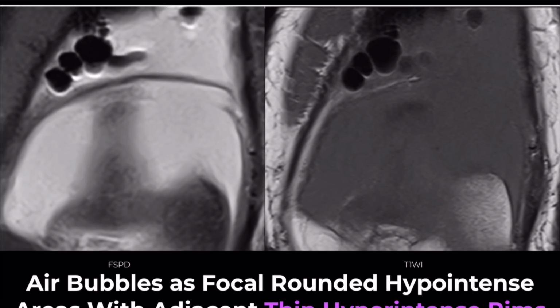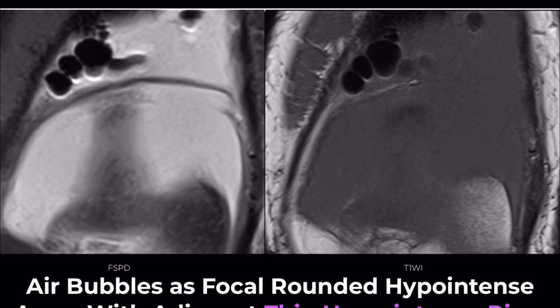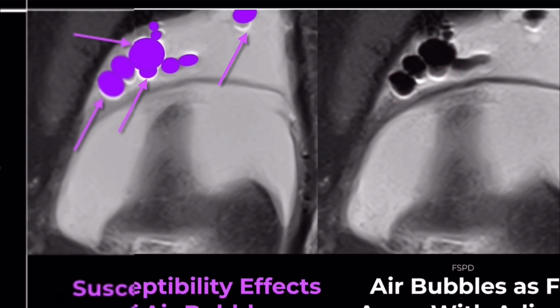Let's start with the first case. This patient had an MRI taken shortly after surgery. The findings indicate the presence of intra-articular gas.